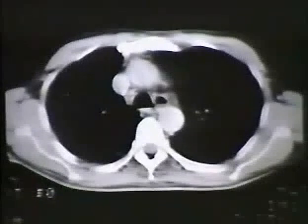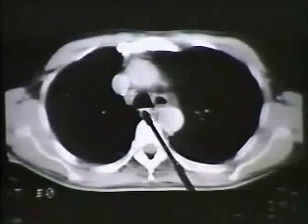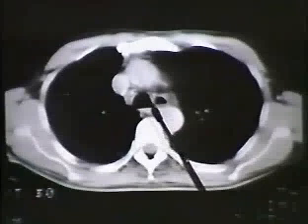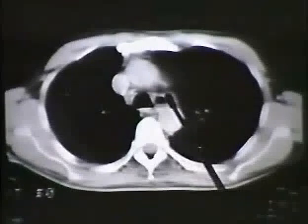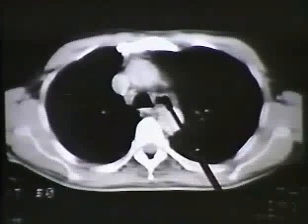An interesting finding that you'll sometimes see on CT scans as you look in the AP window is this air bubble. Now, what's that doing in there? What do we have available for air bubbles? We have the esophagus. On the other hand, it looks like the esophagus is still back here behind the trachea. If you do serial cuts on that patient, you'll see that the esophagus is stretched out around the trachea and underneath the aortic arch. You will see this in some patients with a tortuous aorta.